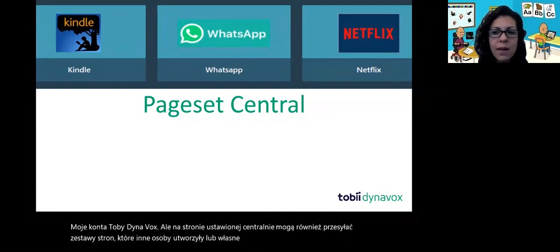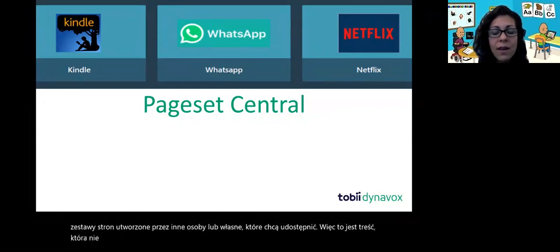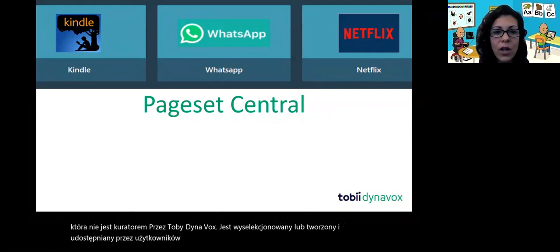So this is content that is not curated by Tobii Dynavox. It's created and shared by users. But there is also content that Tobii Dynavox has created and shared on PageSet Central. So let's get in and just take a quick look.